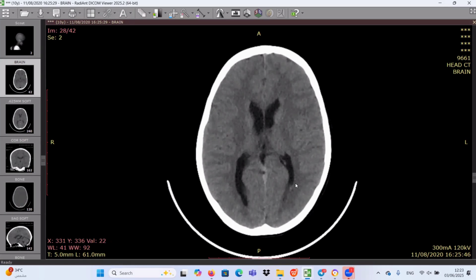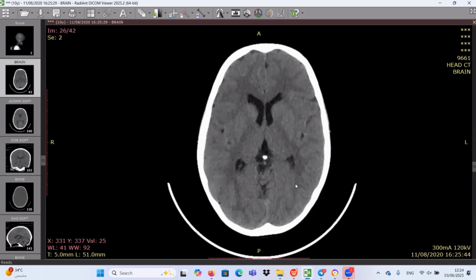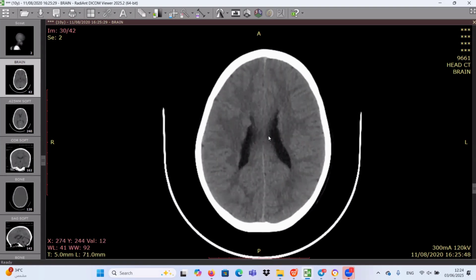Let's focus on the abnormalities that you mentioned before, that we have a corrugated outline. Can you please go to the lateral ventricles? Yes, here, please. We have a corrugated outline of both lateral ventricles, and I think it's very obvious here. As you said, these may be subependymal nodules, and you raised the possibility of tuberous sclerosis. Do you have any other differential diagnosis for the case?